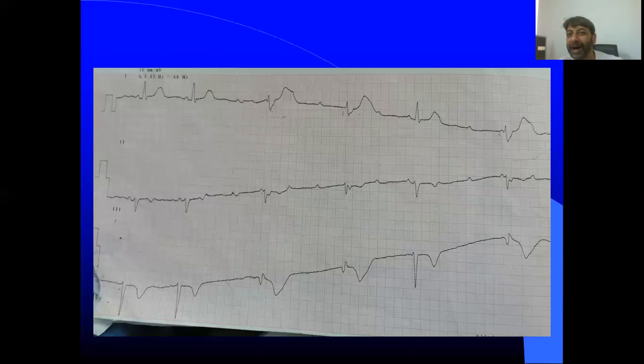It's forming again a hump. So I think one of the P is within the distal limb of that T. And then you again have a P without QRS and again a broad complex. So this broad complex is again an escape.